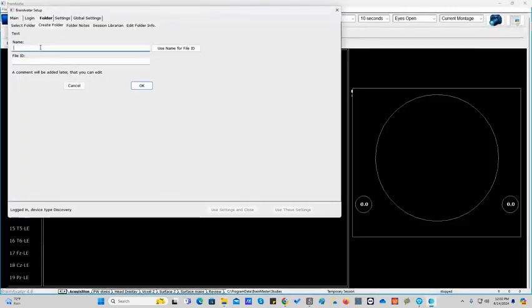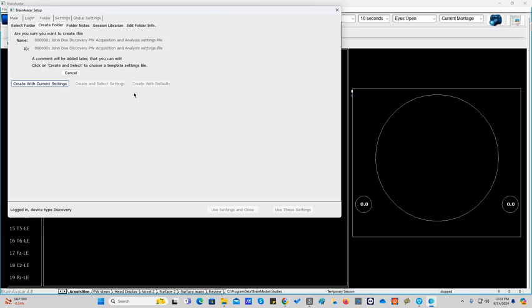And I'm going to put in the name of our subject, and I'm going to give him a number. Now, in your clinic, you may only have a designated number or ID. But for our purposes, we're just going to call it John Doe. And then I'm going to paste in the name of the acquisition and analysis settings file because I had copied it earlier. And now I'll click OK.